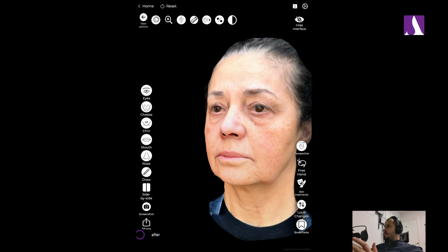Today we're going to treat the topic of facelift with our 3D simulator. Just going to repeat very quickly how you can create the case. You have other topics, other videos on that. You just need to scan the patient very quickly.